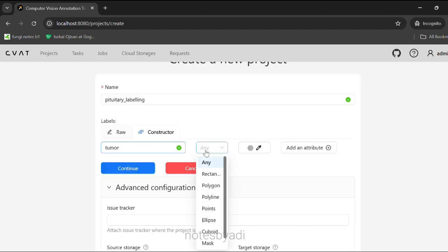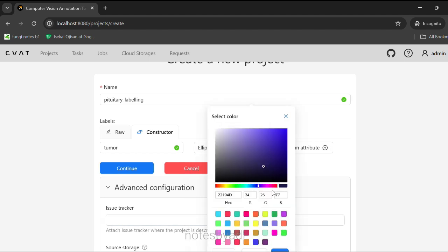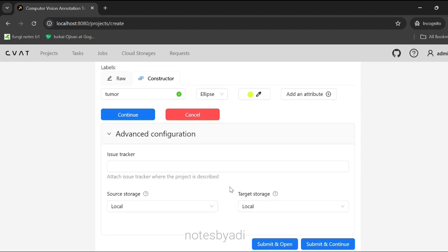From here, I can choose what type of annotation or color can be assigned to certain shapes of the annotation. I am choosing green color since it is better visible against a black background. You can have various more shapes and pre-assigned colors to those shapes.